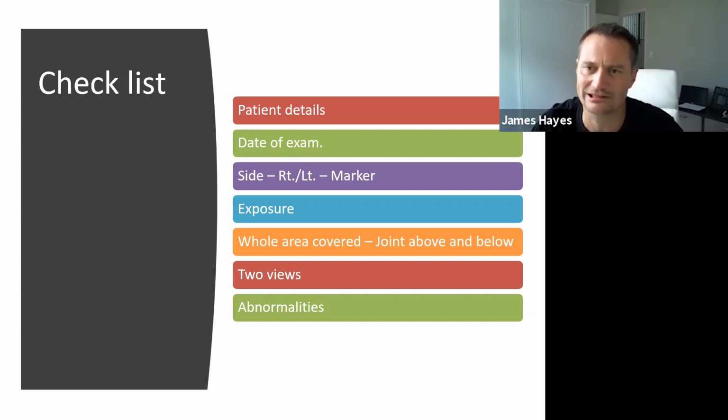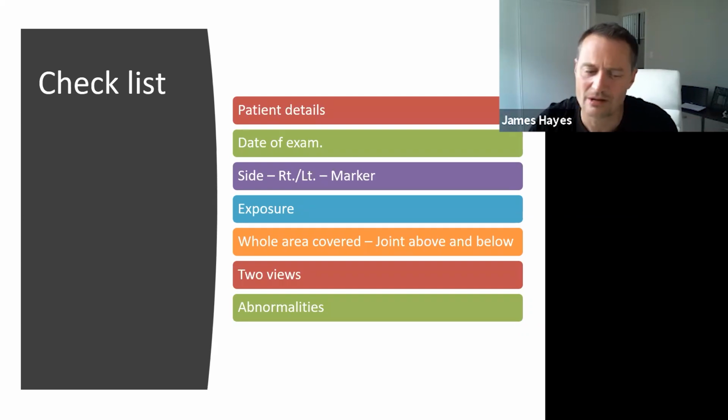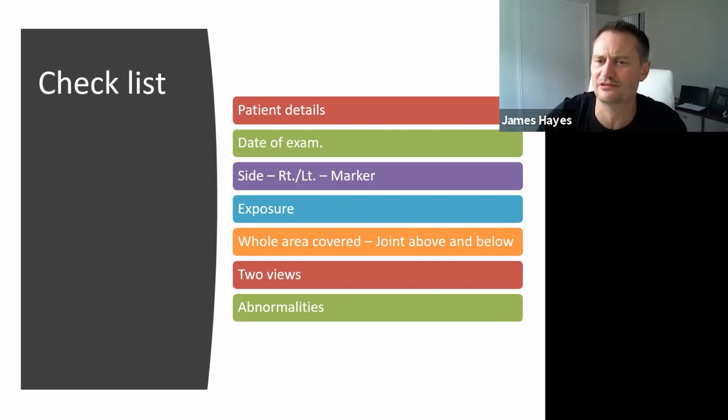So as tedious as it is, you always have to check the patient details. And I think I just spent 7 minutes telling you to look at the name, okay? But do it, because it solves an awful lot of problems. The date of the exam, you might sort of wonder who cares, but it does actually make a difference, especially if you've got a patient in for something like a pneumothorax, because yesterday they might not have been doing so well, and today they might have been.